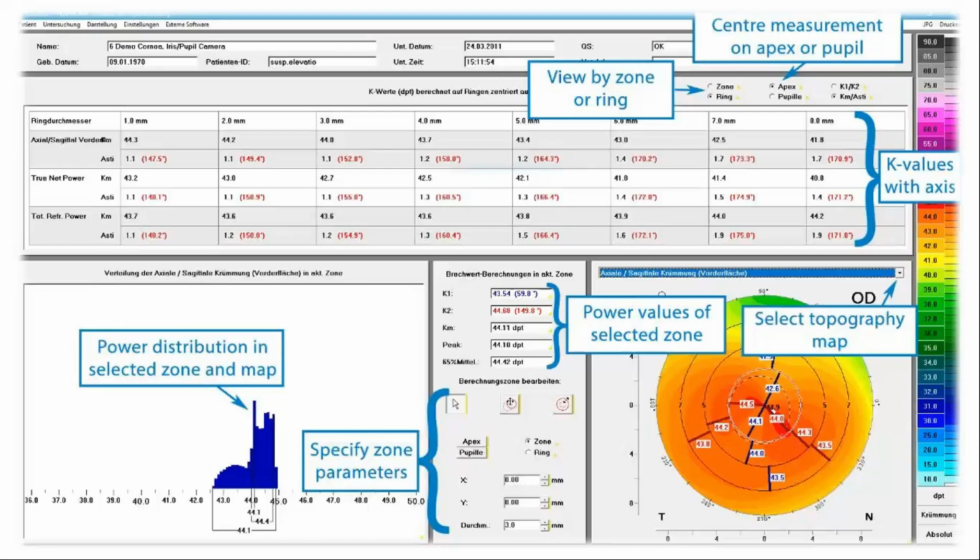Okay. And of course, you can also look at the table. Yes, sir. Yes, you can look at it from the table also. But again, it's easy here because you just select it and you will not go wrong in what you're picking up because it'll just show it to you correctly.